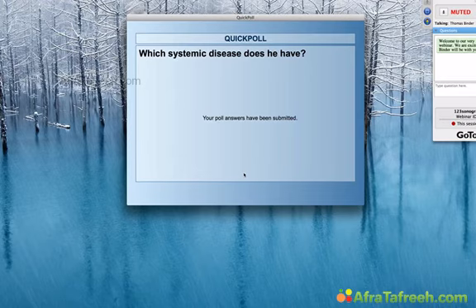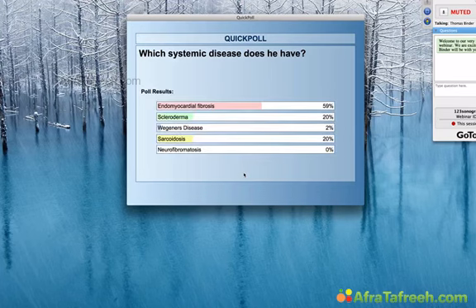Okay, I hope you can see it this time. I can see people voting. So I guess a lot of you are true echo experts already. Maybe some of you have even seen this image loop before, because I think I even used it in my presentation in the masterclass. Okay, let's close the poll.